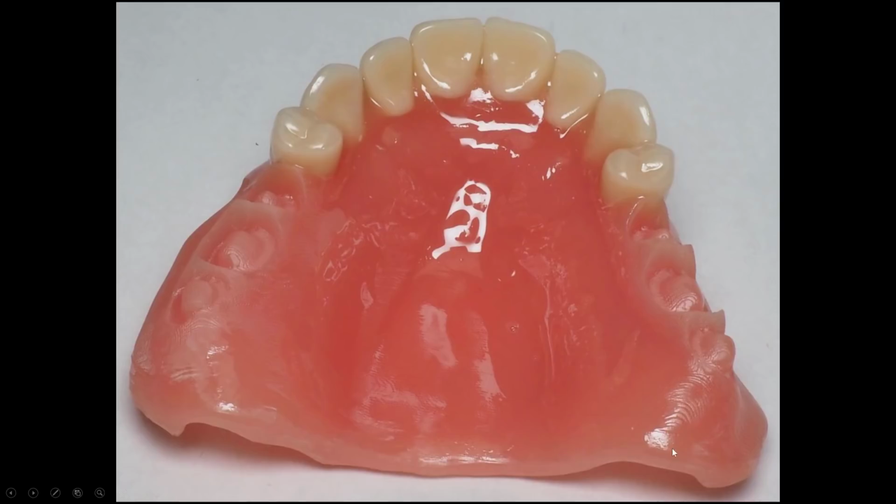You can also see the difference here between how it's going to look straight out of the printer, where it's going to have these layer lines between it, and what it will look like if you paint over it with a very thin layer of that uncured printing resin. So I don't polish these with pumice because you would spend a lot of time getting rid of those printing lines with pumice or with burrs. I actually just use some additional resin, paint that on, get it nice and smooth.